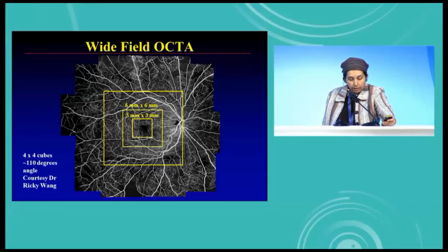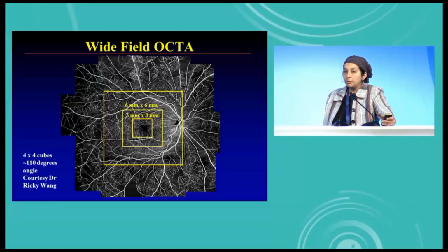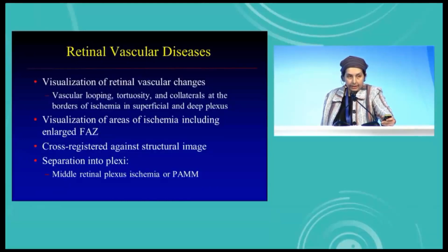And as you can see over there, if you're patient enough and are able to montage enough cases, you start seeing the beginnings of these areas of non-perfusion, as well as this peripheral neovascularization, which is really what you're looking for when you're doing the ultra-wide field images on your Optos. So I think this is going to be another area of huge growth, where eventually we'll move from just being able to visualize the macula on OCT angiography to it taking off in terms of ultra-wide field imaging and giving us that kind of information.